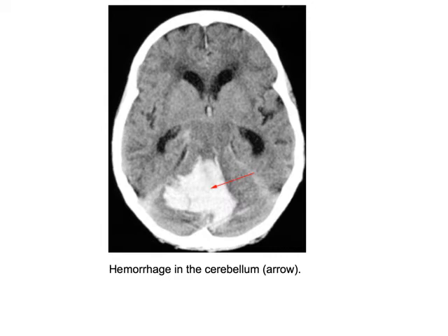Here's a hemorrhage of the cerebellum, right? One of the things that we've noticed throughout these images is that they are enhancing without contrast for the most part, except for the malformation, and the edges are ragged in appearance. It's just something to keep in the back of our mind as we're comparing different kinds of pathology.